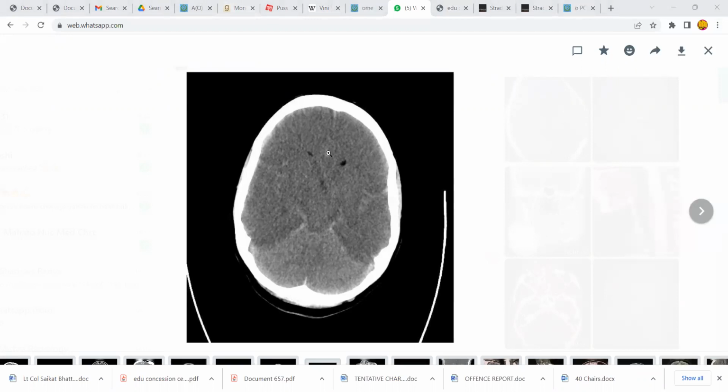This patient might have had a cardiac collapse in the emergency, and then they revived the patient and finally could ventilate the patient, but remained comatose. And then when the CT was done, it showed this. But yeah, gross cerebral edema. Generally, we have a white cerebellum sign because of the better sympathetic control of the circulation in the posterior circulation.